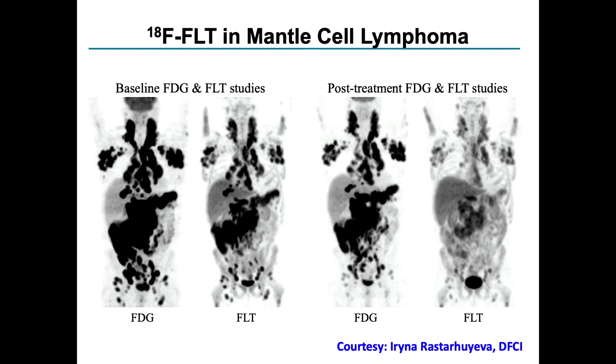So I show FDG versus FLT in a couple of cases of mantle cell lymphoma, one in particular here, just to illustrate that although we really don't use FLT these days because FDG is more intense, typically at sites of disease, if we are looking for response assessment, and you'll get more talks on that later in the day, it can be helpful to use a different radiopharmaceutical that might show the response better.